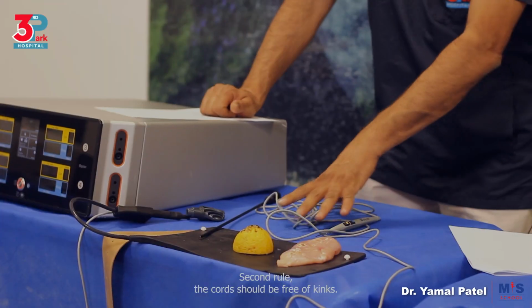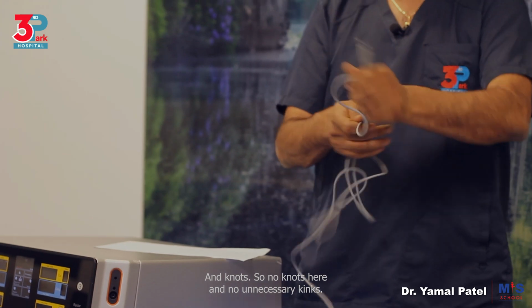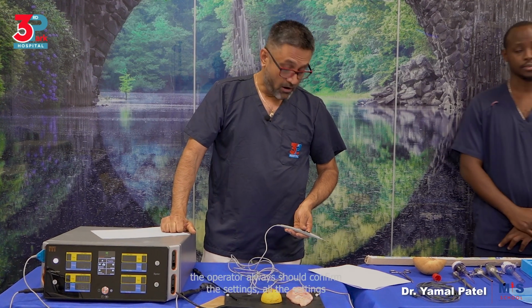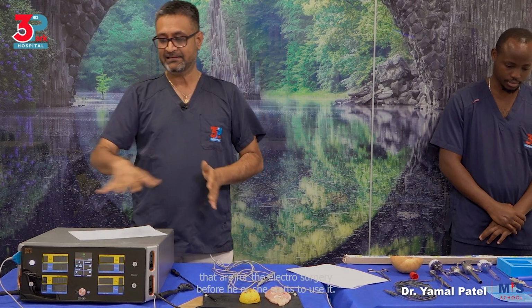Second rule, the cords should be free of kinks and knots. So no knots here and no unnecessary kinks, and definitely don't tie it around a metal instrument like a towel clip. The third thing, the operator always should confirm all the settings for the electrosurgery before he or she starts to use it. It's not the job of the staff around you to do that for you. It's still your job as the captain of the ship to verify the settings, confirm the settings, and then start off with using it.